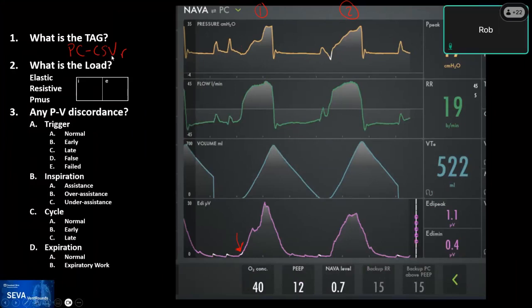It's just kind of complicated, isn't it? Yeah, it's one of those, but it's important for you to recognize this, because sometimes you will see a breath trigger on one side, and it may make you think that NAVA is not working. It's just that one of them is triggering first before the other one.